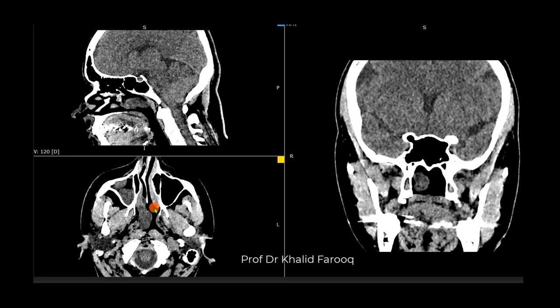Here we see MPR images. This is right-sided DNS and inferior nasal turbinate, with a polyp in the right nasal cavity extending into the right nasopharynx, and polypoidal soft tissue in the right maxillary sinus, suggesting mucosal thickening, with a differential of retention cyst and polyps in the right maxillary sinus.